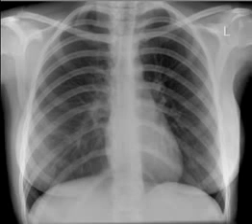There is a systematic approach and protocol to be followed, and this way you make sure that you do not miss any area and thus do not miss any pathology. Some radiologists will follow their own routine and will step by step look at the lung parenchyma, trachea, mediastinum, bony rib cage, cardiac size, retrocardiac area, height of diaphragms, costophrenic angles, cardiodiaphragmatic angles.